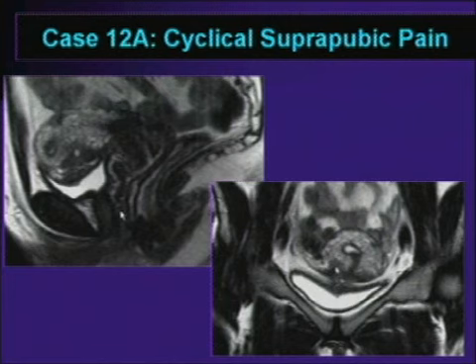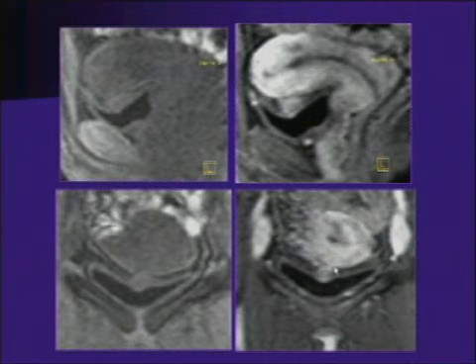On subsequent images, the bladder filled up. It became more apparent that this was already in the wall of the bladder and was associated with some unusual appearance of the myometrium, the appearance of adenomyosis. On post-contrast images, you can see this is enhancing, which can happen with endometriotic implants, and this is suspected to be endometriosis involving the bladder.